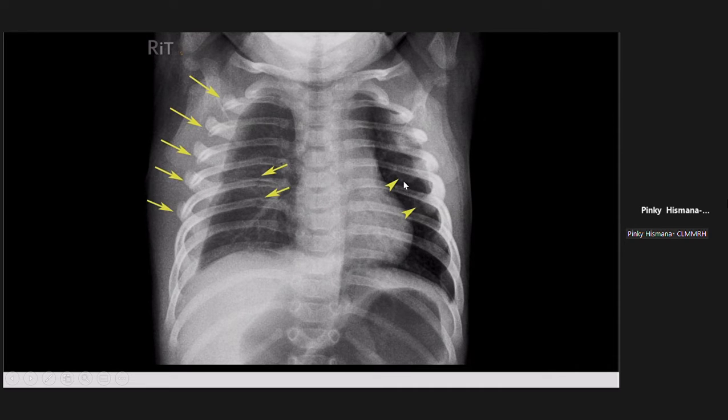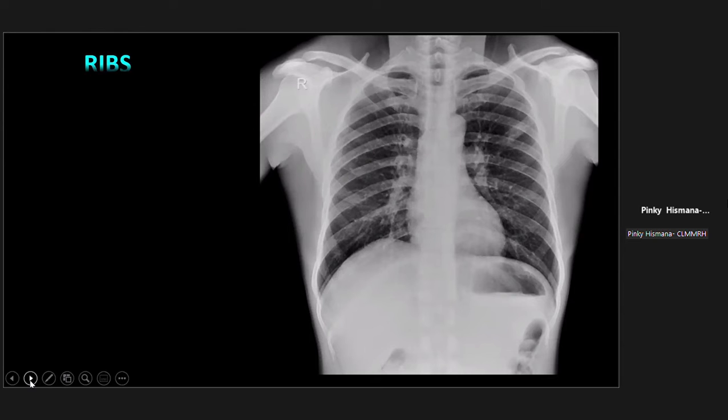So this one here is the anterior. But nevertheless, I'm going to show you later more clearly. So when we talk about the ribs, we have the anterior segment. That's an example of the anterior segment. Okay. Then we also have the lateral angle.